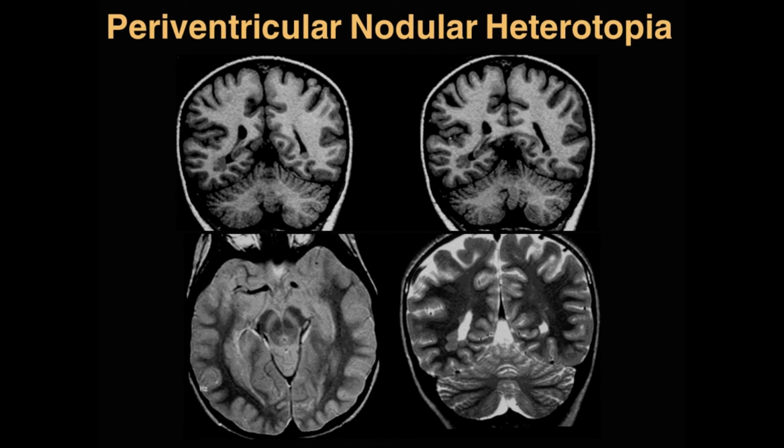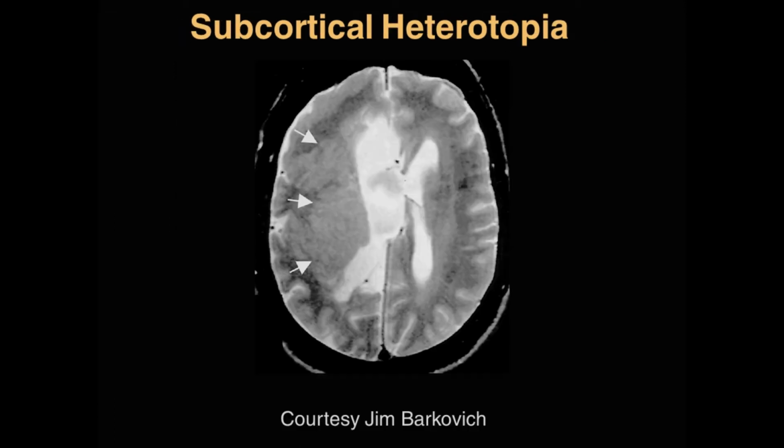So here, for example, these periventricular nodular heterotopia, again, on my coronal plane, I always want to check the edge of the occipital horns. These seem to occur very commonly here. It's hard to see these if you're just looking at axial imaging. So we need to know where to look, and we have to specifically interrogate the edges of the ventricles for these sorts of nodular heterotopia. And it's easiest to do, at least in my experience, in that coronal plane.